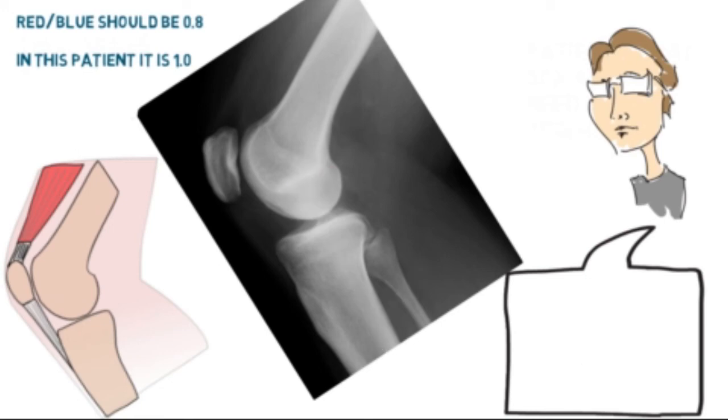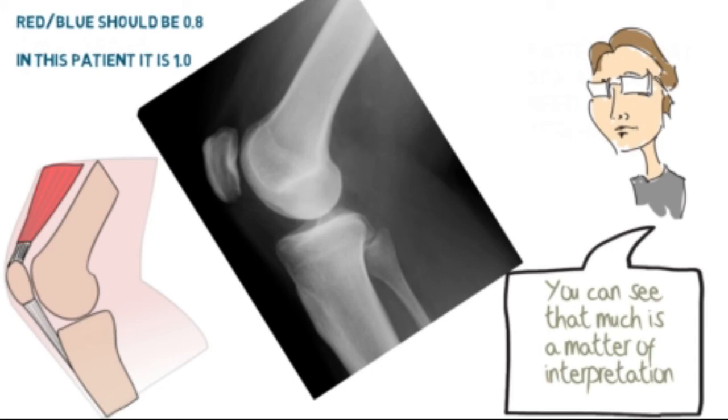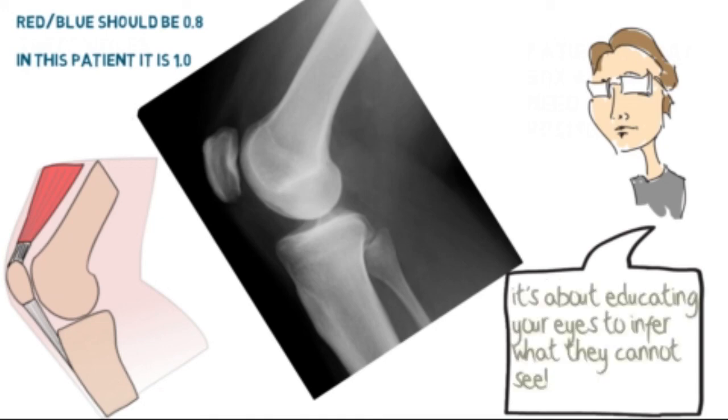It is clear by now that X-rays are all about interpretation. I won't go into this in any more detail. That's enough for you to absorb in one go. But the real message here is that it's not simply a matter of looking at the bones themselves, but their relationship to one another, the junctions between the bones, looking for abnormalities where soft tissues would come into contact with the bones, and making inferences, perhaps following through with another investigation which may be more costly.